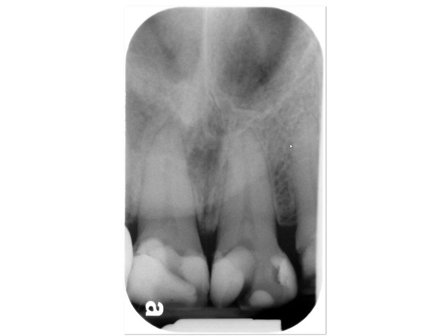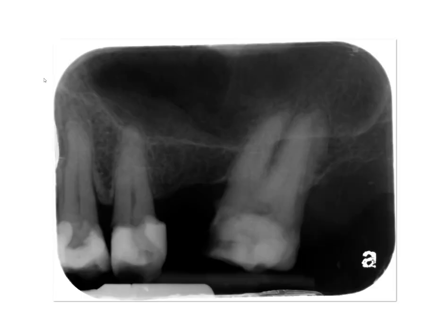One thing to note is there is this radiopaque line, where everything above that line is a little bit more opaque, and below that line it's a little more radiolucent. That's the soft tissue of the nose. Maxillary sinus, or the floor of the maxillary sinus, we're starting to see most likely the zygomatic process of maxilla and the inferior border of the zygoma.